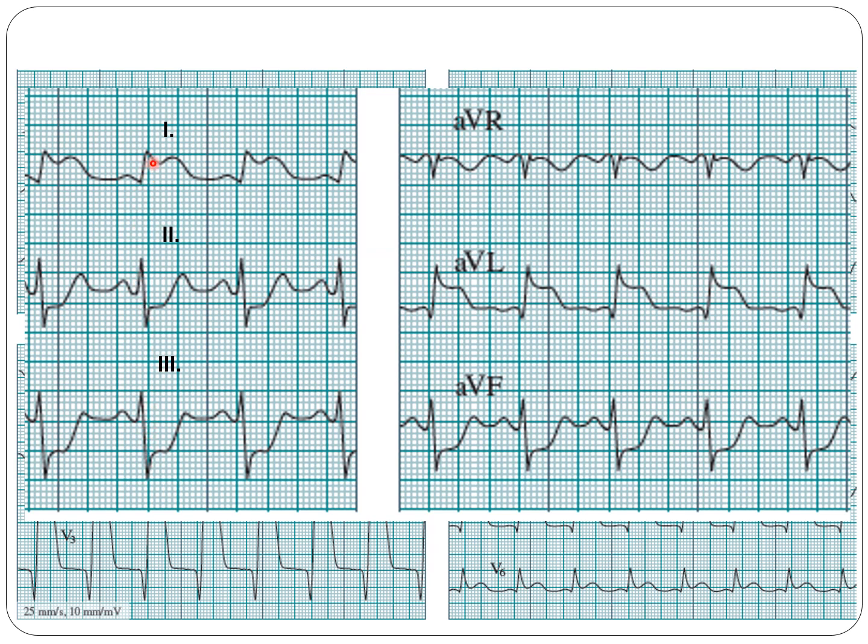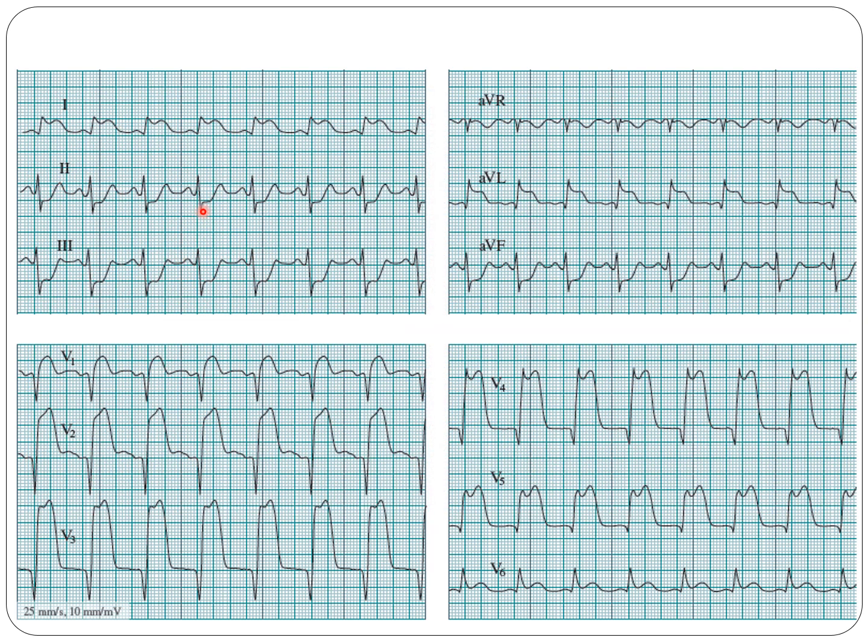The axis: lead 1 positive, AVF is negative. Lead number 2 is a little bit more negative, so I would go for the minus 40 degrees. Looking at the pathologic condition, you can see lead number 1, AVL, negative Q wave, and ST elevation.